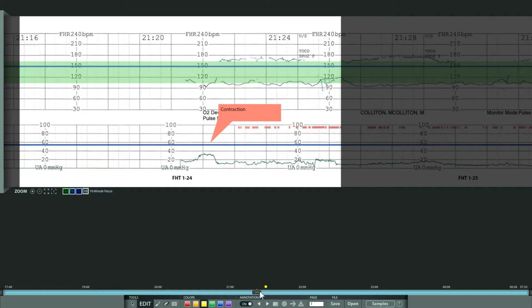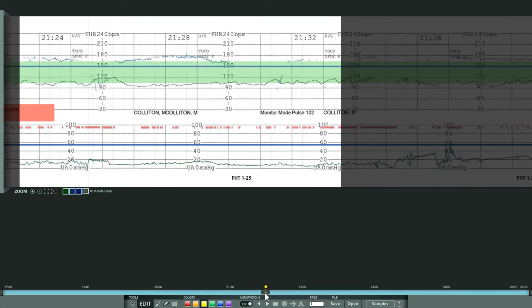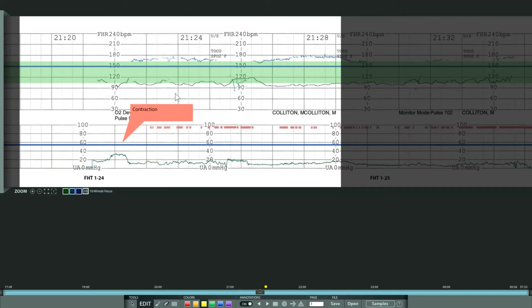You'll notice that when I do toggle on, that I've created now a hotspot, which is going to be a yellow button where if I go along anywhere on this, it will end up bringing it to the very front of that. So easier to go around.